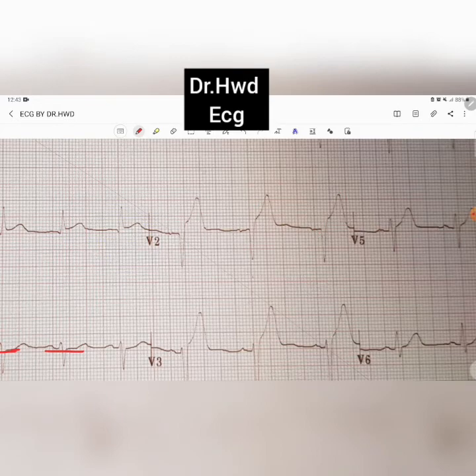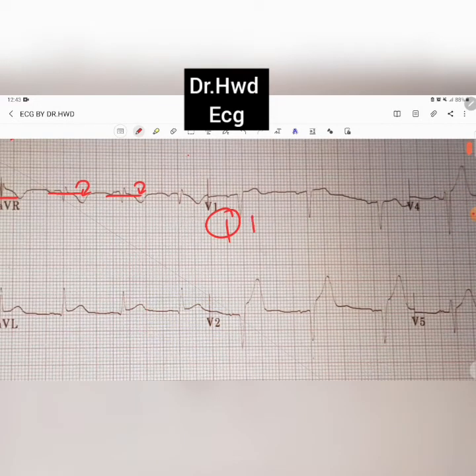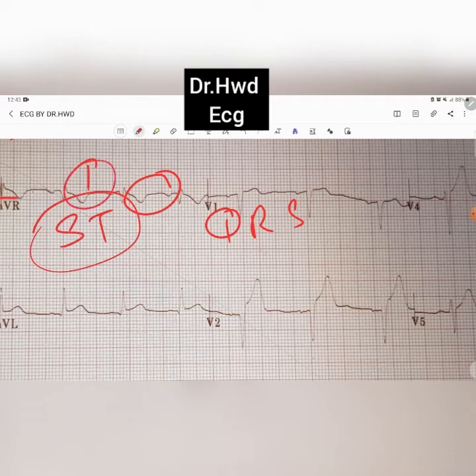Now in the QRS complex, you remember I told you that you're looking at 3 things, or maybe 2 things. What are you looking at? You're looking at the ST segment, whether there's a depression, as you saw in here. In your QRS, you look at whether there's a depression or an elevation. There's such a prominent elevation, right? This is the baseline, elevated ST segment. And the next thing you look at is the T wave. The T wave is elevated and tall and tented, right? So there is ST elevation with your tall tented T waves.